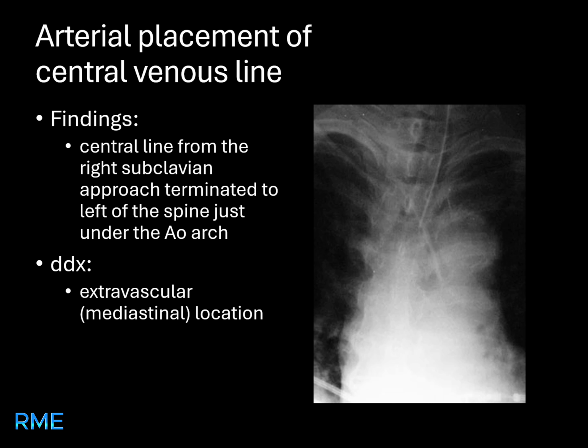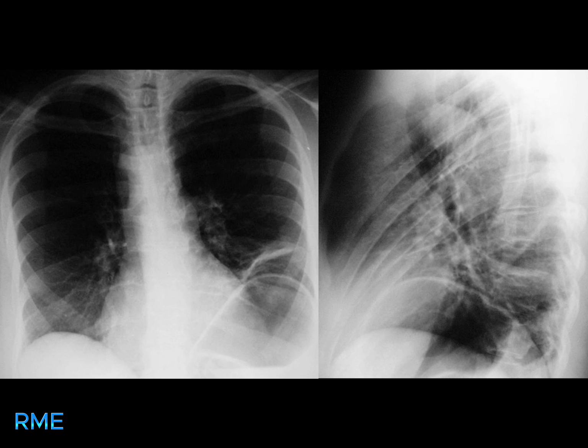To further evaluate, I would recommend a chest X-ray or CT scan to confirm the malposition. Management involves immediate removal of the line and repositioning it correctly with monitoring for any vascular complications. Let's move to the next case.